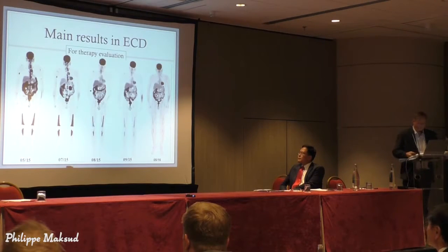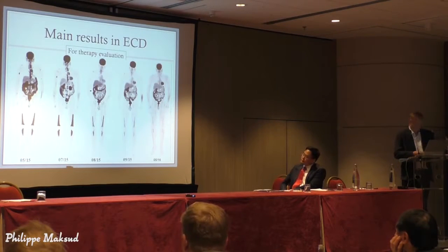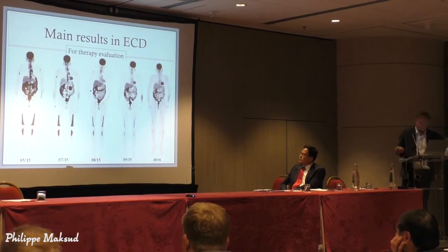Another application of nuclear medicine is treatment response. The first examination on the left is the baseline before treatment. As you can see in the follow-up, at the first 3 months and 1 year later, you can see the progressive regression of abnormal signal in bones and mediastinum. Bones, and here mediastinum.